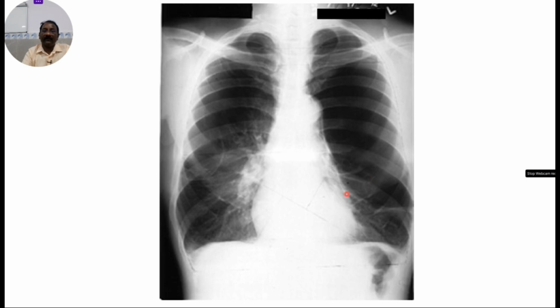See here the diaphragms. Usually you expect concave diaphragms. So the diaphragms are usually like this in routine X-rays. But here there is a flattening of the diaphragms. This is because of the elongation of the lung fields. And again in the heart also you can have a tubular heart.